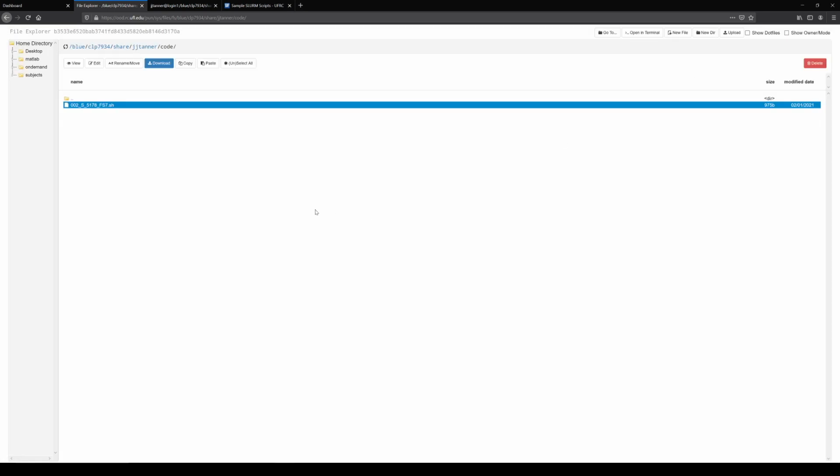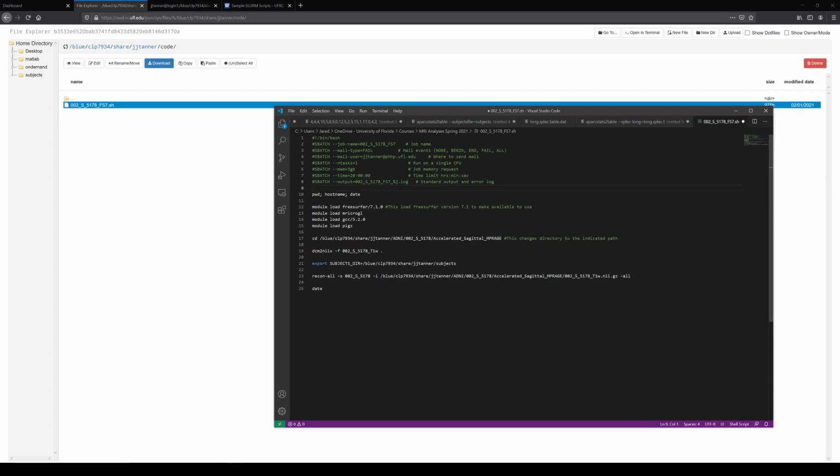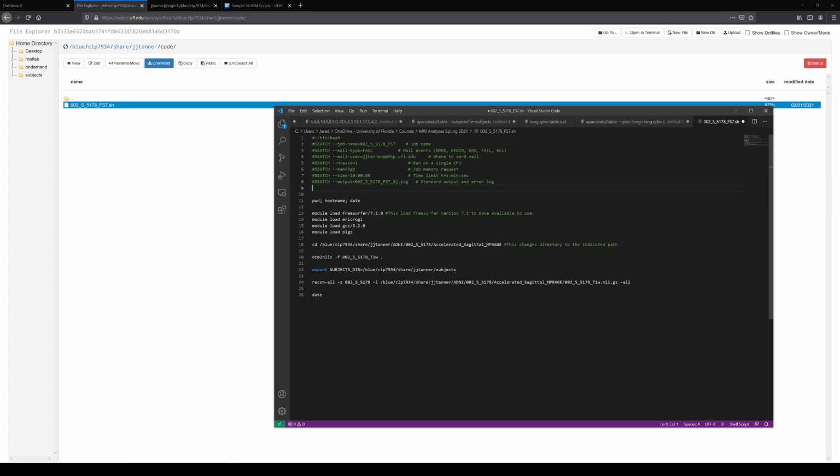So there are two things wrong with that script. So what's wrong with that script? That's why I just viewed it. Here, let's show you what's wrong with that script. We need to change the account on here. Most of you don't have to do this. I do. I say something's wrong with the script. Not really wrong, but we want to change this.